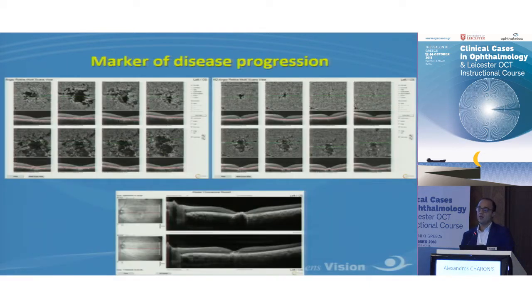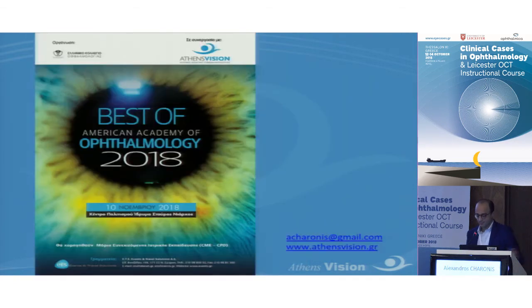And in other diseases, this is an unexplained, non-diagnosed patient with some kind of inflammatory lesion at the level of the pigment epithelium. You could follow these patients with autofluorescence, but I really found that following these patients with OCT angiography, showing the blood flow loss or decreased signal in the deeper layers, helps us a lot in terms of monitoring the disease. So with this, I would like to thank you very much for your attention.